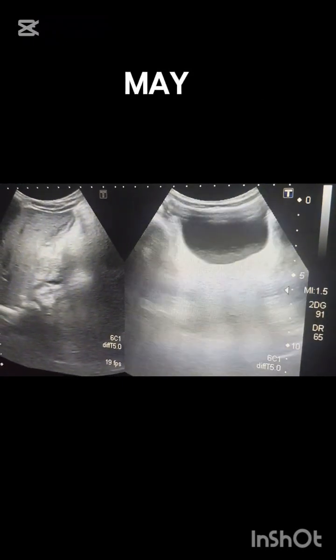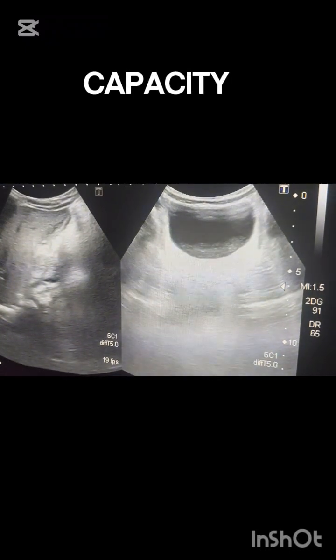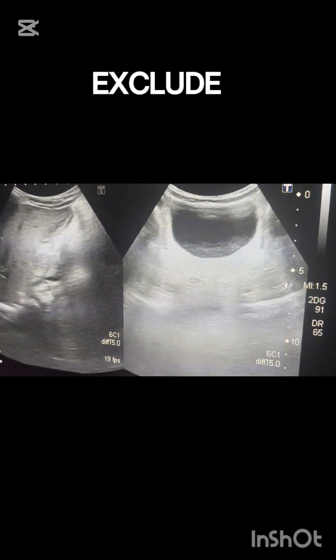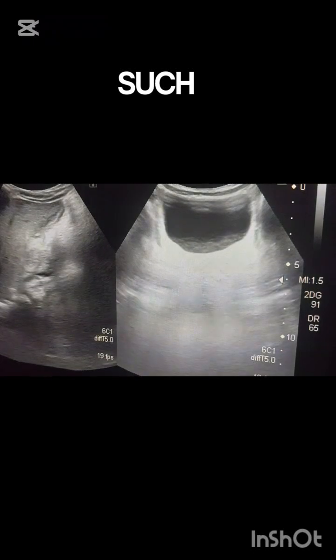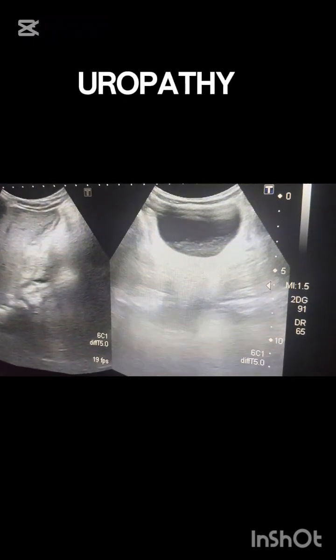Chronic cystitis may lead to trabeculated bladder walls and reduced bladder capacity. Ultrasound also helps to exclude associated pathologies such as bladder calculi, diverticula, or obstructive uropathy.